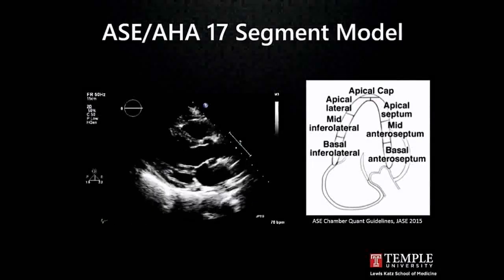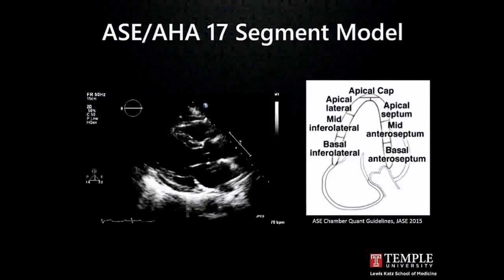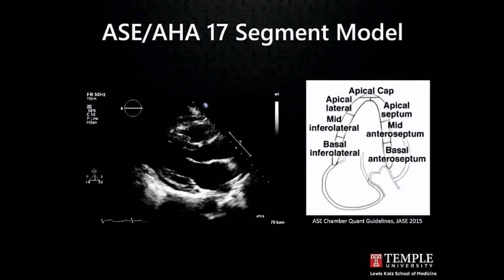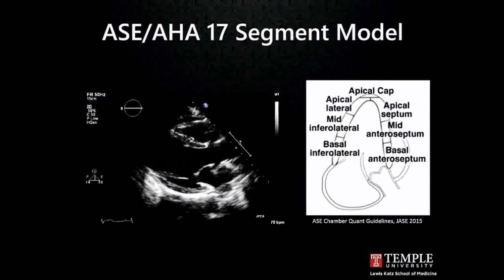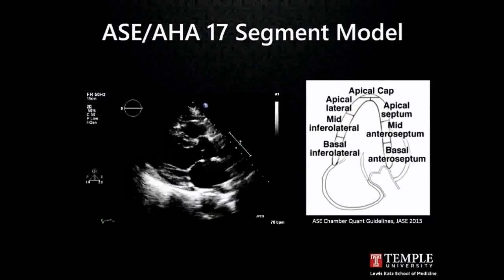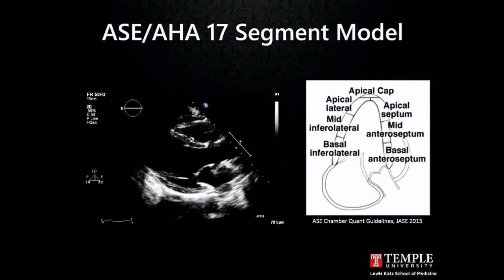So why else does on-axis imaging matter? Well, because we've developed this universal language to describe the myocardial segments in the heart, so that when Dr. Lashner talks to Dr. Peters about some wall motion abnormality, they're talking about the same thing, the same finding. In this case, the on-axis parasternal long, as all of you know, I'm belaboring the point, but it's something that you use on a day-to-day basis. With the appropriate image, you're identifying the appropriate myocardial segments and describing the heart in a universal language. I've shown an apical 3 labeling of the segments, but this is a parasternal long axis.